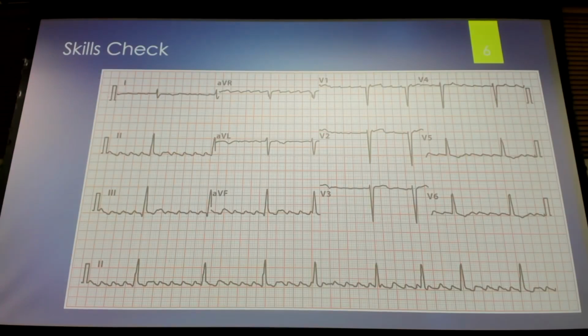This is atrial fibrillation. Then this is our last one. Okay, sir, what do you think's going on here? So there's the normal, would you call it rate? Rate? Okay, yeah. And then it's the variable P wave. There's a 5-to-1, I think it's a 4-to-1, and a 3.